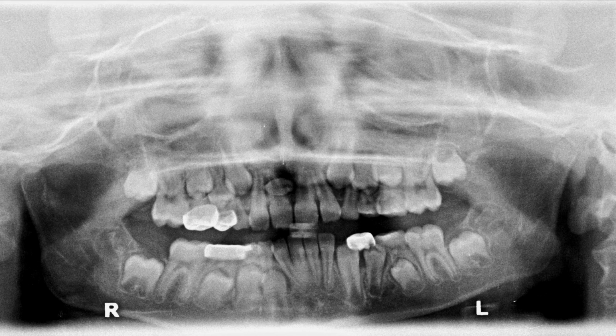In this video, we're going to compare the image quality of panoramic radiograph versus periapical radiograph. So here we're looking at a panoramic radiograph of a 9-year-old patient, and as you can tell, the image appears rather grainy, and visualizing the precise details of anatomic features, especially the outlines of the roots, is very difficult. However, it does give you a good overall sense of where the roots are. Overall assessment of the root development is possible with panoramic radiograph.